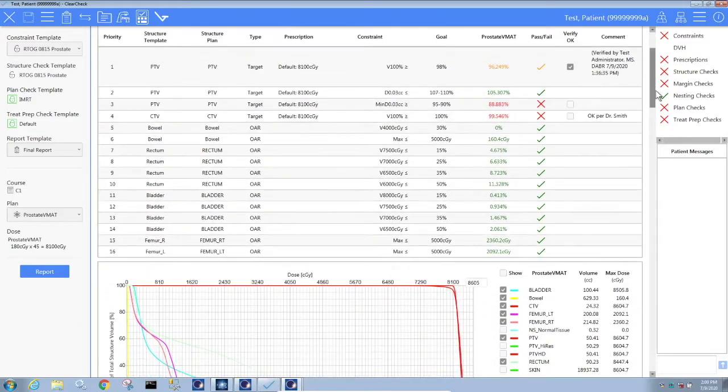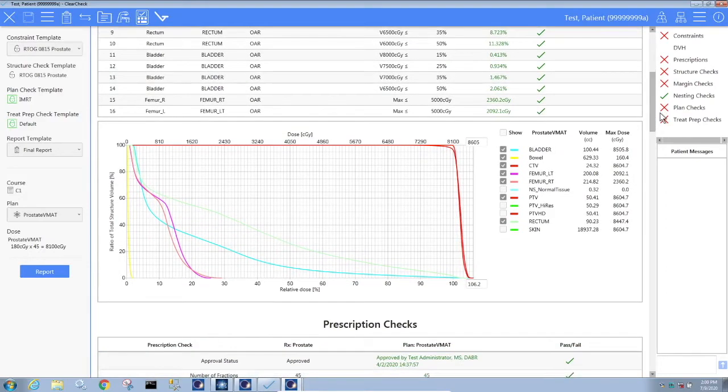So as I scroll down the results here, you'll see another duplicate of your DVH. So this is just the DVH you see in Eclipse, but we've pulled it here into the interface so you can quickly interact with it. So you can click on it, you can click on the blue boxes, hand type in a value, and quickly jump to any location you'd like to see. So if there's maybe something else you wanted to check on the DVH, you can do that right here.